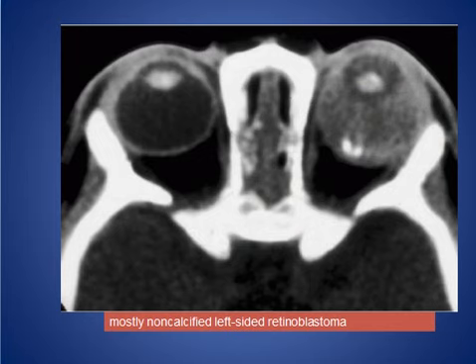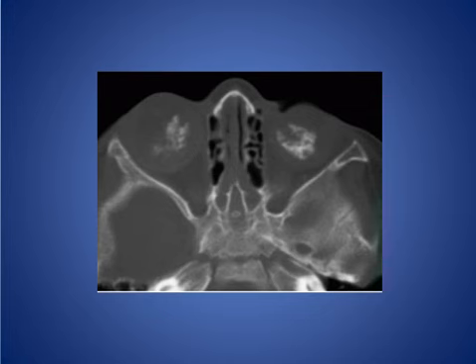We see also that disorders of calcium and phosphorus metabolism may cause ocular calcification. Radiation is one of the causes of globe calcification, especially of the lens, and occasionally choroidal angioma may calcify. This is another patient with bilateral retinoblastoma with calcification.